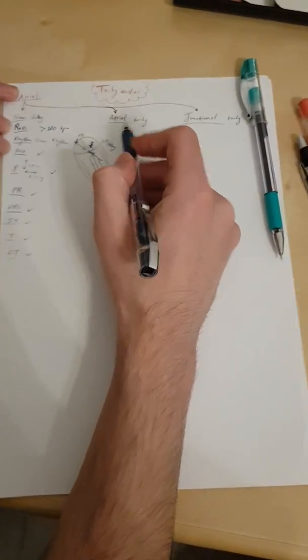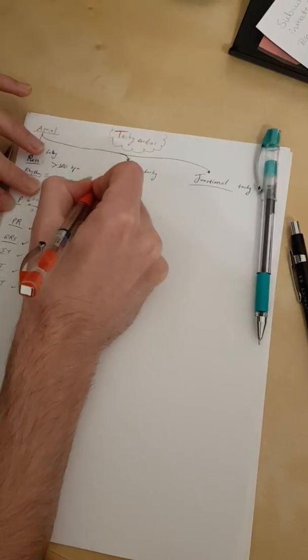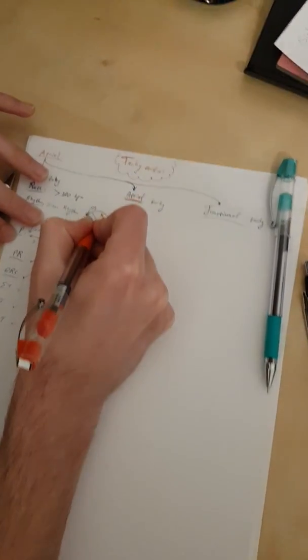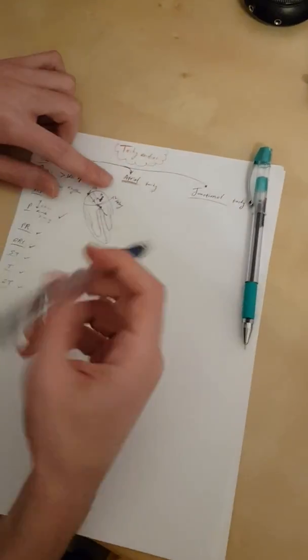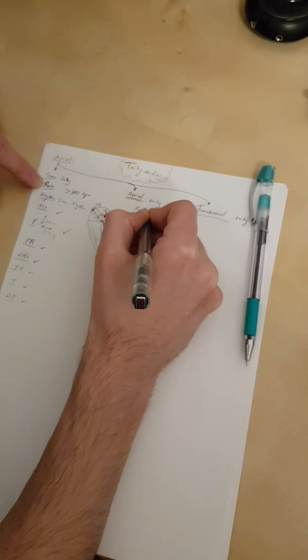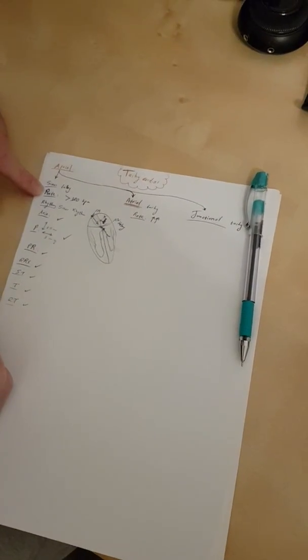Okay? Now, atrial tachy, when we said atrial, so here's the red line there, it means it's coming from this point right here. So this point is giving us extra beats and causing more. So how will you see it? Rate, also gonna be high. I'm just gonna write the abnormal stuff. So rate is increased, more than 100.